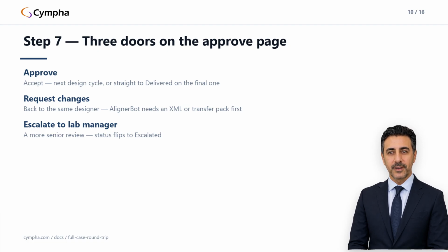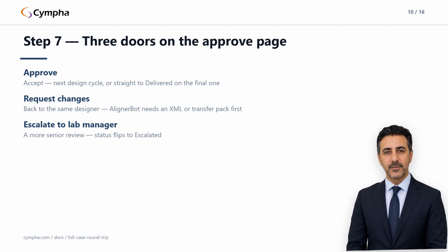Door 2, request changes. This bounces the case back to the designer who built it, and the status flips to changes requested. The clinician describes what they want changed in the case chat. But there's one important exception here, and it catches people.